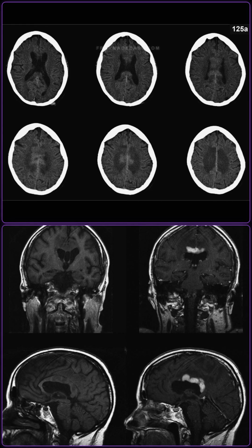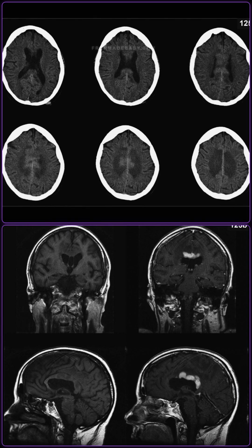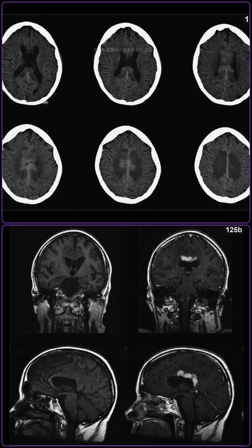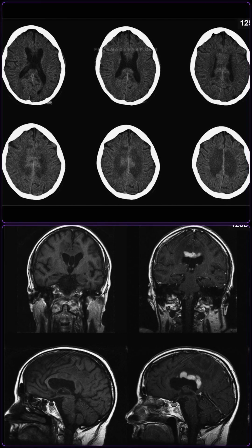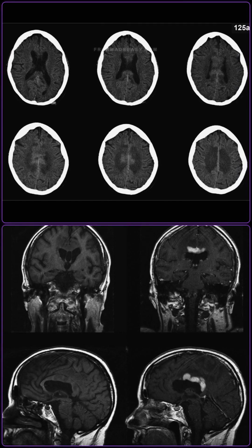In that case, the diagnosis is a butterfly glioblastoma multiforme, also termed glioblastoma, WHO grade 4. The differential diagnosis for a midline crossing corpus callosal lesion includes a primary CNS lymphoma, a demyelinating plaque from multiple sclerosis, and a tumefactive demyelinating lesion. Glioblastoma and primary CNS lymphoma are the two most common and important entities to distinguish in this region.